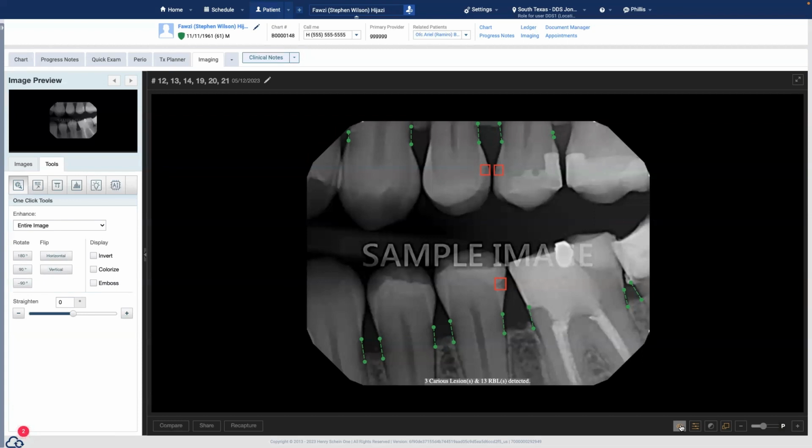Right. And I also want to bring this up, that when the hygienist is waiting for me and this picture is on a 40-inch TV in front of the patient, they can start educating the patient about the lack of flossing, the plaque control, things like that. It's very effective and patients really like it.